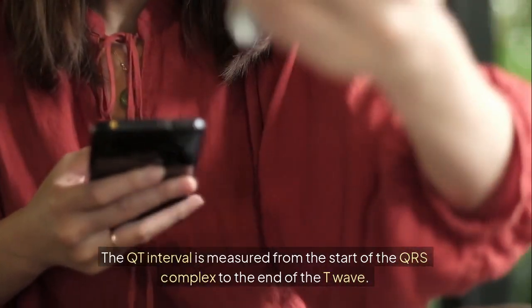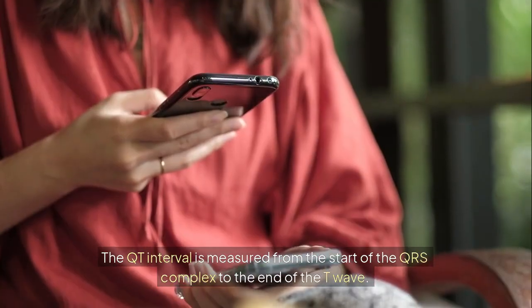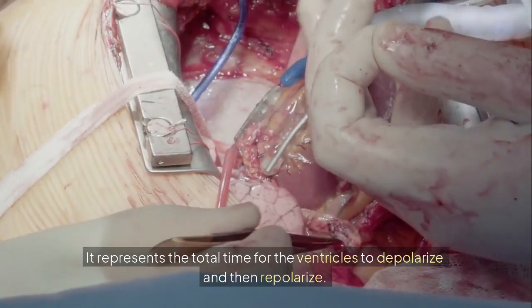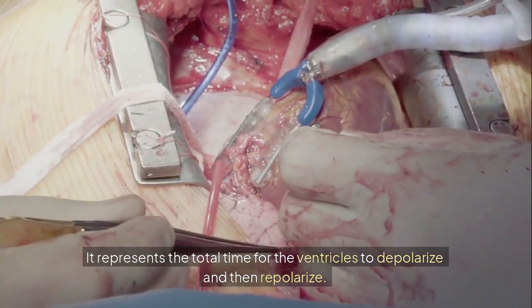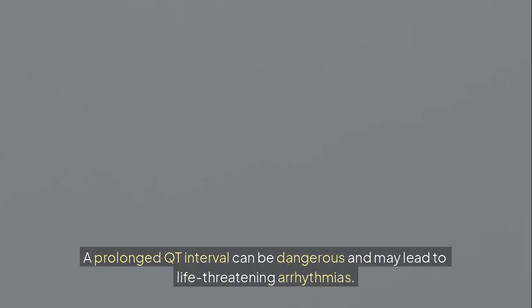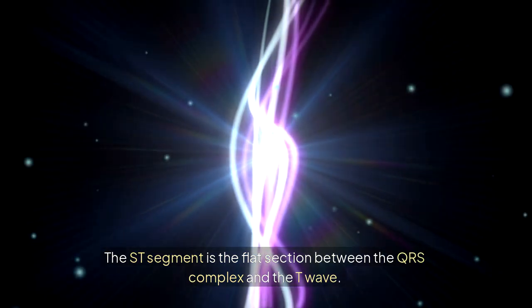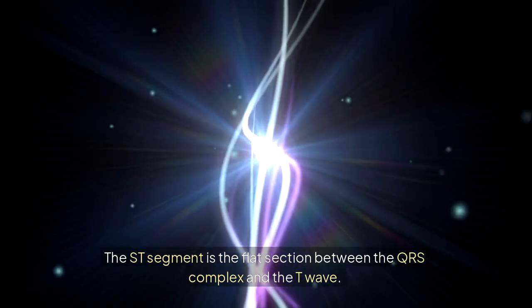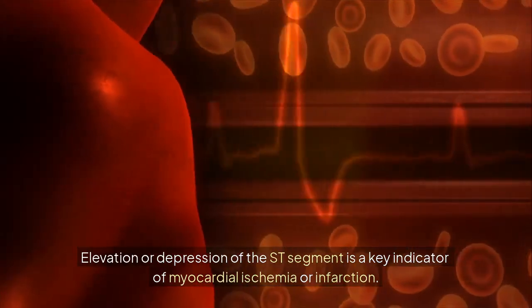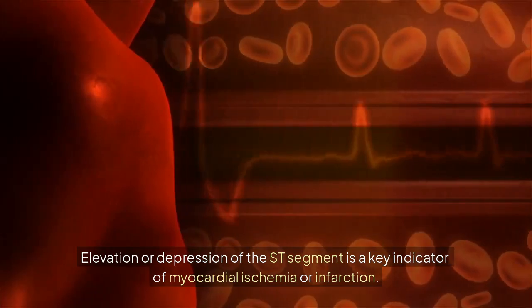The QT interval is measured from the start of the QRS complex to the end of the T wave. It represents the total time for the ventricles to depolarize and then repolarize. A prolonged QT interval can be dangerous and may lead to life-threatening arrhythmias. The ST segment is the flat section between the QRS complex and the T wave. Elevation or depression of the ST segment is a key indicator of myocardial ischemia or infarction.